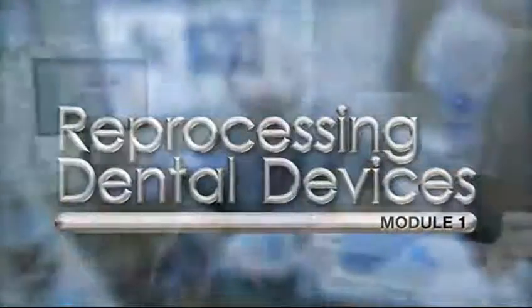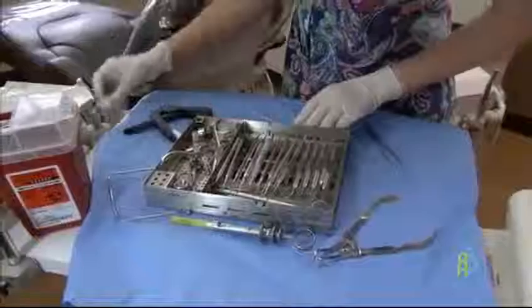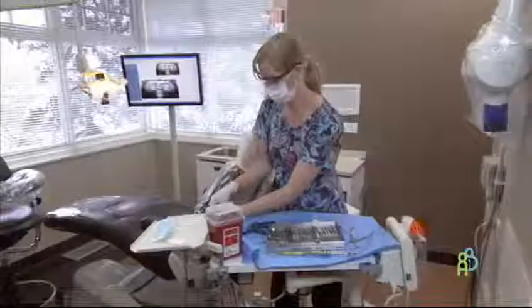In all dental clinics, it's critical to prevent the transmission of disease caused by microorganisms found on used dental devices. The 3 modules in our learning series outline the proper procedures to follow to correctly reprocess used dental devices so they're safe for reuse. Infection prevention and control practices are aimed at controlling the transmission of infectious diseases.